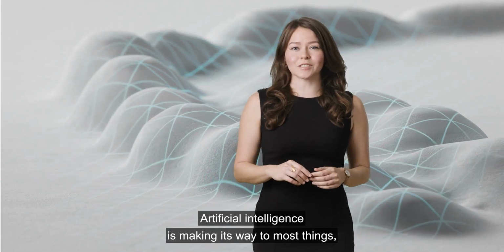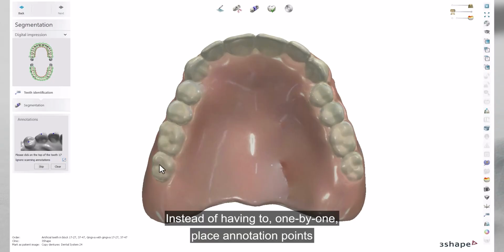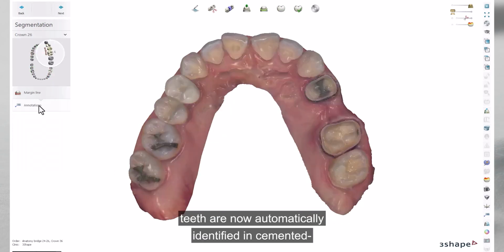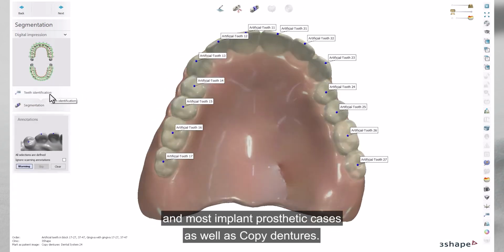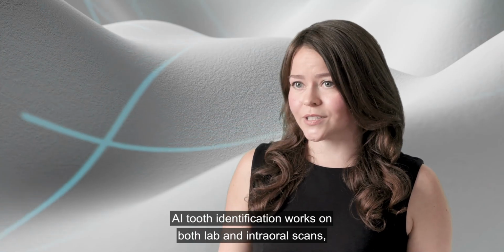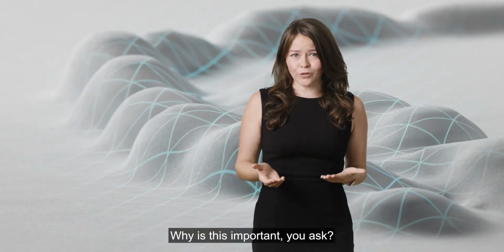Artificial intelligence is making its way to most things, and Dental System 2024 is no exception. Instead of having to place annotation points one by one for each tooth in the design, with the help of AI, teeth are now automatically identified in cemented and most implant prosthetic cases, as well as copy dentures. AI tooth identification works on both lab and intraoral scans, and you of course still have the control to edit the annotations if needed. Why is this important, you ask?